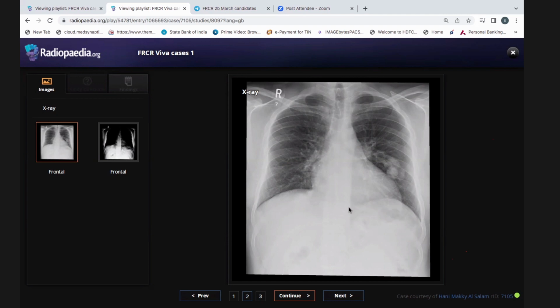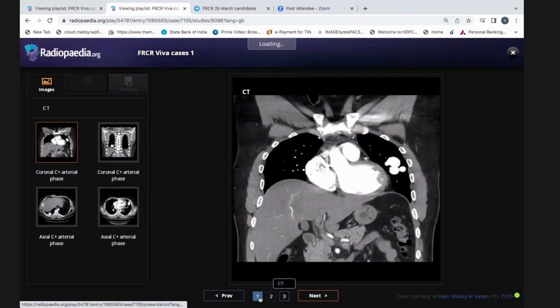No pneumothorax or pleural effusion could be detected. Upon this history, I'm worried about pulmonary AVM, arteriovenous malformation. So I would check any available previous imaging and do further CT chest with contrast and ultrasound to check for associated hereditary hemorrhagic telangiectasia.